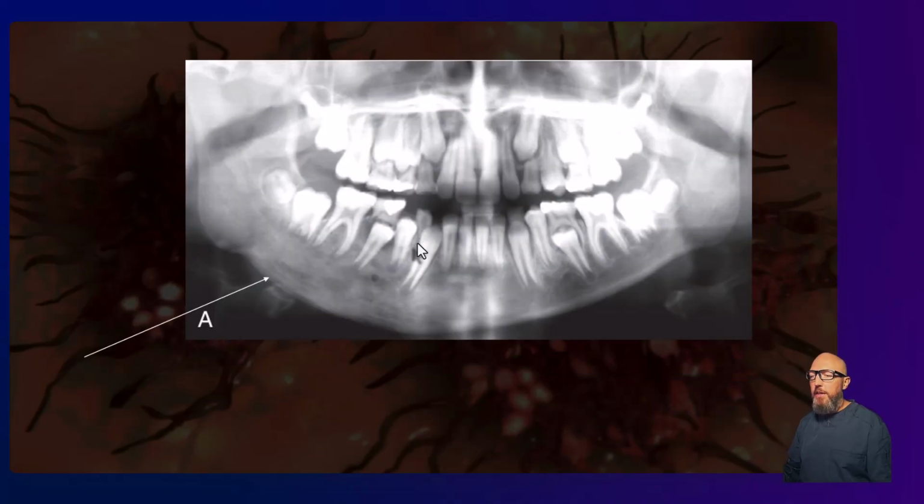And there are a few other things that do create onion skin periosteal reaction, but the first one that should come to mind is osteomyelitis. This one, just glancing at it, looks kind of ground glass, kind of expanding like fibrous dysplasia. Teeth may not really be affected, but what's the arrow indicating?